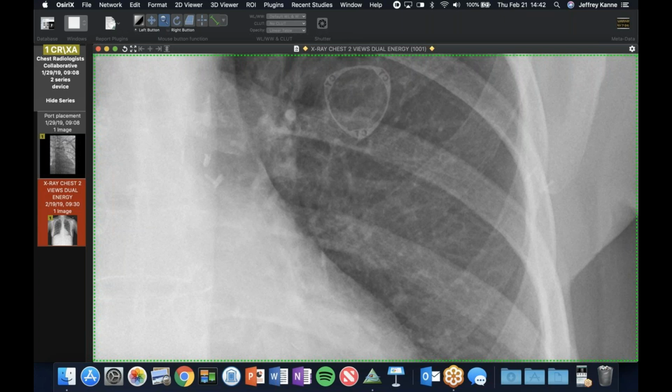So this port flipped 180 degrees along the vertical axis. I learned this from you, David, that you showed a case years ago of the backwards letter. So the back of the port is now facing the front of the patient, so their little needle can't get through it because they're often metal on the backside or solid material.